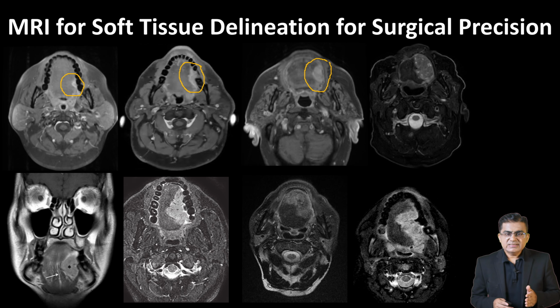He will likely require a wide partial glossectomy or a hemiglossectomy. If the surgeon can get a safe 1 cm deep margin without cutting the septum, a wide partial glossectomy will work. Otherwise, a proper hemiglossectomy is needed. Patient 4 on top right, this is a deeply infiltrating tumor. It replaces a large part of left tongue muscles and goes deep towards the root, but it does not cross the midline. He will require a hemiglossectomy. The surgeon will remove the entire left half of the tongue using the lingual septum as the medial surgical boundary.